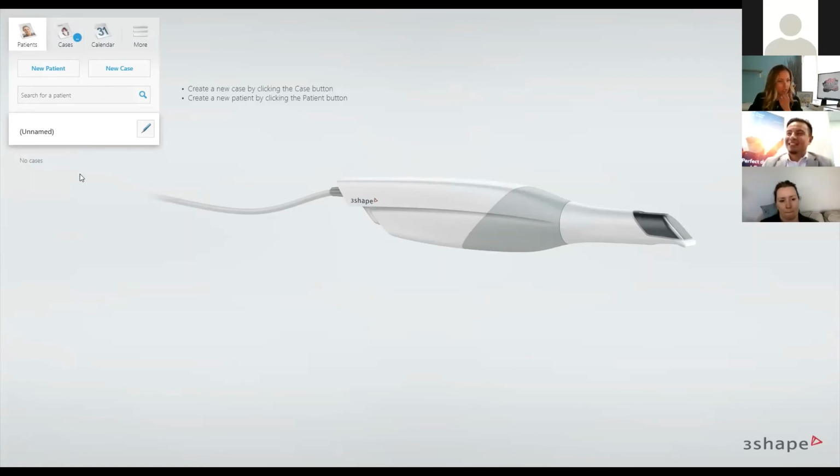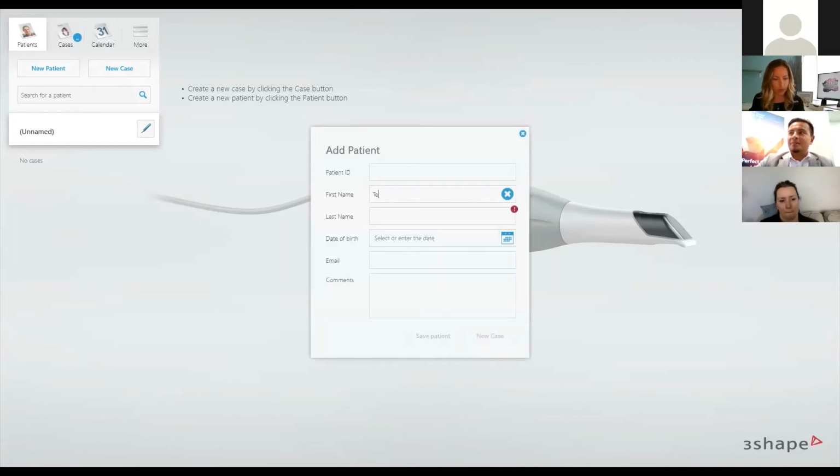So we're going to start this case. I'm going to just pull in Mr. Parsons' photo. I'm going to walk you through a brief overview of how I would basically do this real time. Okay, it's going to take a little longer because I'm going to discuss some of the features on here. So hopefully everything works.